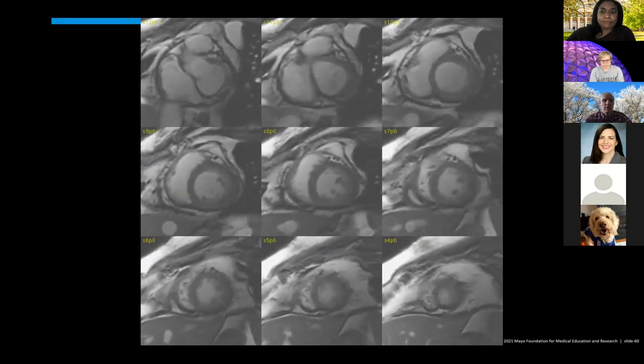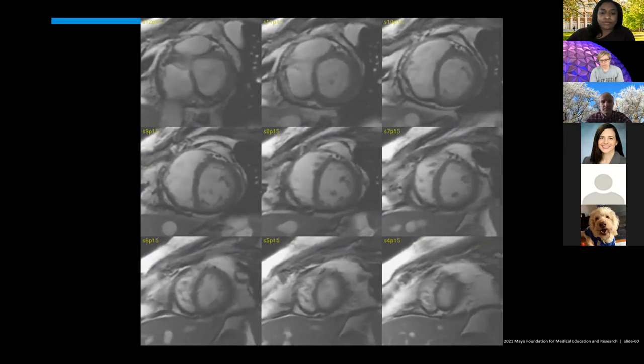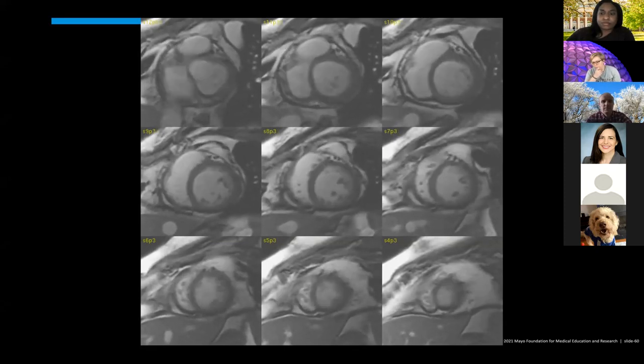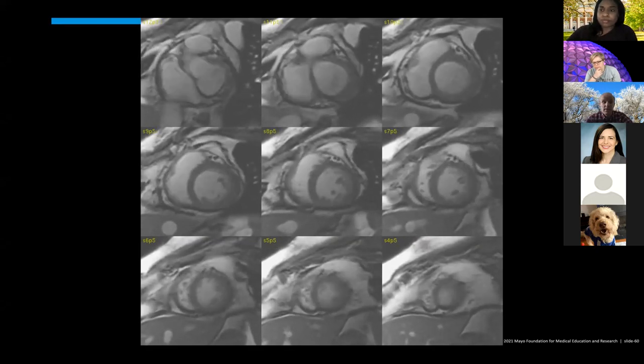But one of the classic diagnoses that gives you a septal bounce that this patient has is, let you think about that for a little bit. So one of the primary diagnoses that we associate with a septal bounce is constrictive physiology.